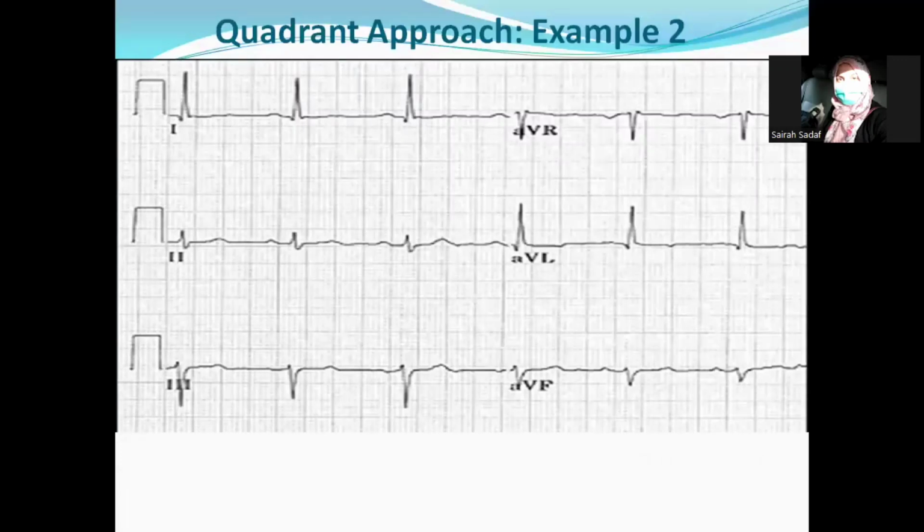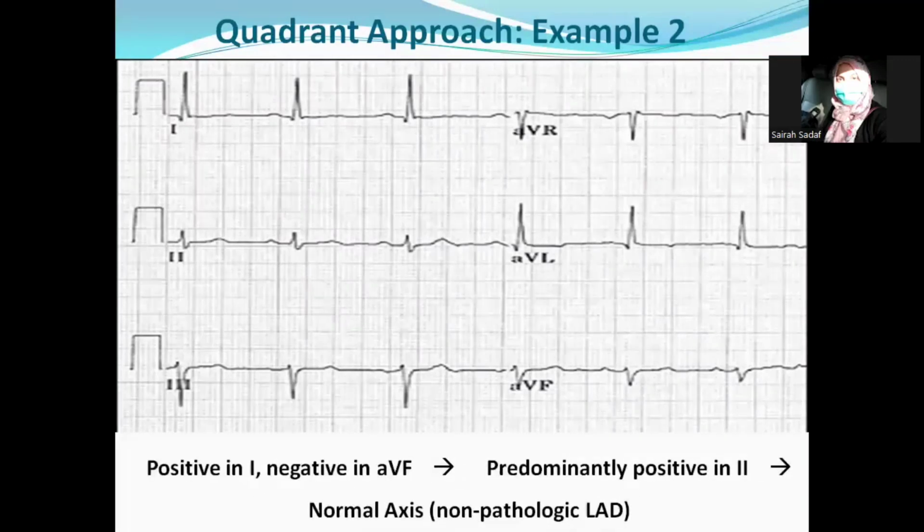Jennifer is saying left. Yeah, it's almost left. Left non-pathological. Okay. Left pathological. Let's see if it's pathological or not. Okay, let's see the answer. It's non-pathological. Yes, very good. Adnan was saying it's left and non-pathological. Well done, Adnan. Yes, you're right.